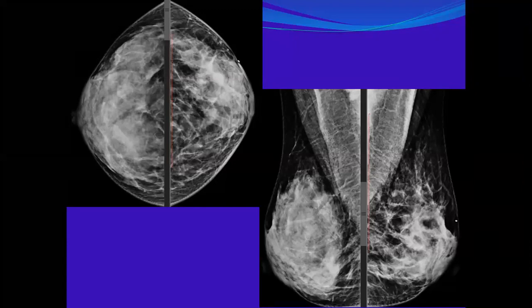At the beginning, we said the asymmetry could be a normal variant and could be a sign of cancer. So how could we differentiate it from other diseases? Yes, I agree with you. This is global asymmetry. So when do I classify an asymmetry as BI-RADS 1, BI-RADS 2, BI-RADS 3, BI-RADS 4 or BI-RADS 5? I have to review the previous mammogram.